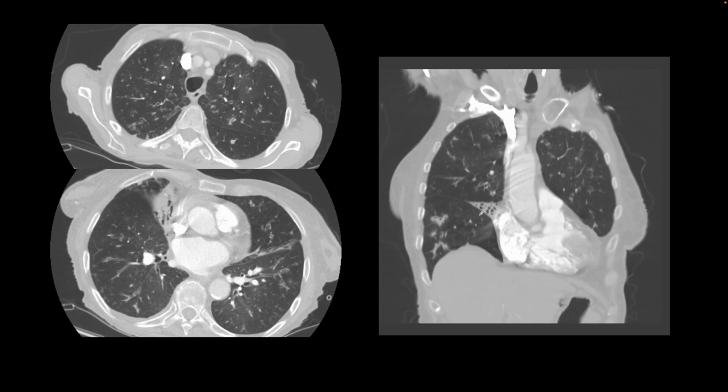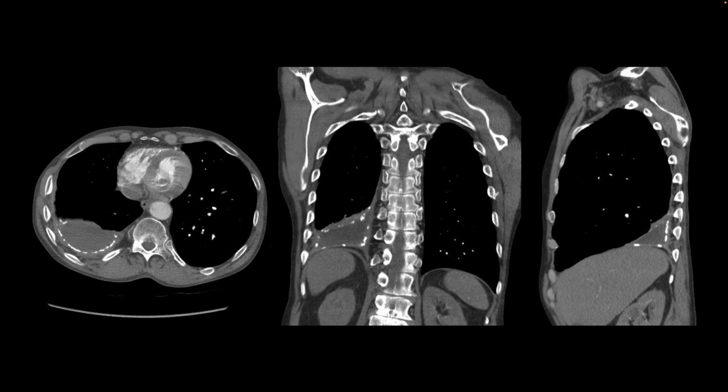This next patient is an elderly female, and she has findings mainly in the middle lobes, suggestive of infection. There is mural thickening of small airways, consolidation, and these findings suggest Lady Windermere syndrome. This is a common boards question. This is our next patient, and we find a loculated pleural effusion with peripheral pleural calcifications.